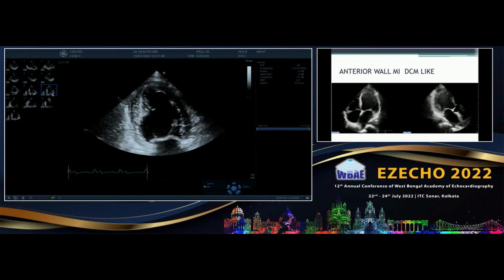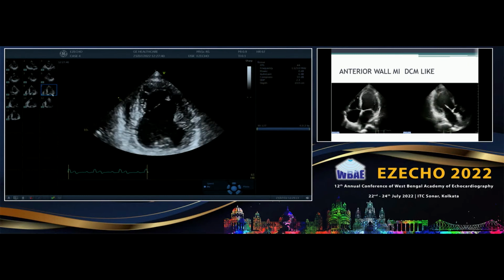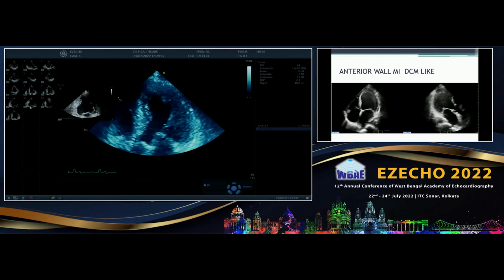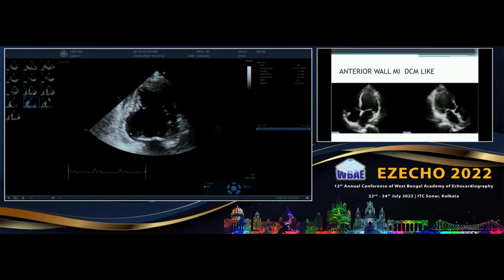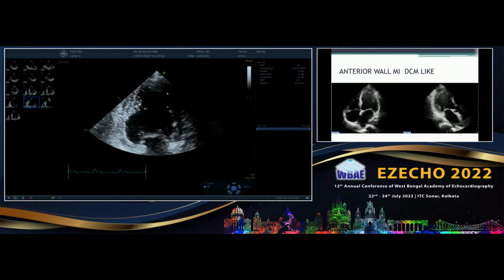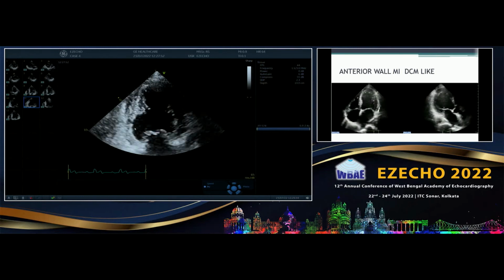Now just take one pointer here, okay? Just one pointer, your measurement pointer or something, you can just put it there, and then look at segment by segment, so you look at one segment at a time, and then you appreciate it much better. What do you appreciate when you are looking at one segment? So looking one segment at a time in any view is important.